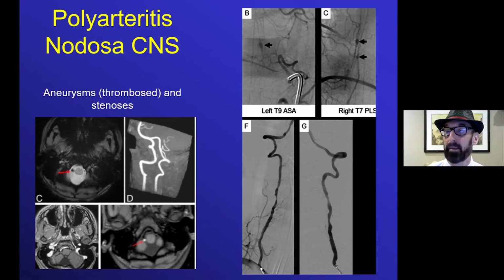So by applying the fat suppression, we eliminate any of the atherosclerotic plaque components being bright. And what we see as the bright signal is usually the hemorrhage in the wall or hemorrhage in the thrombosed aneurysm. Occasionally, you will have that with slow flow and the artifact of slow flow.